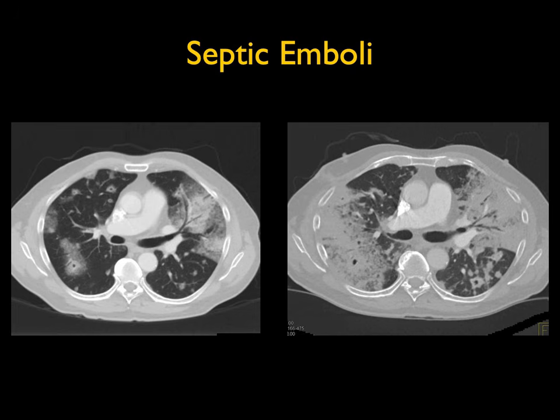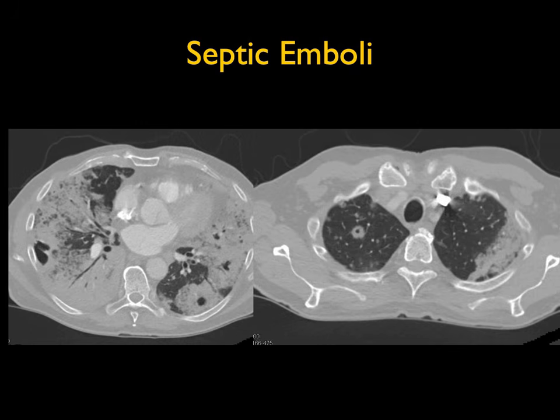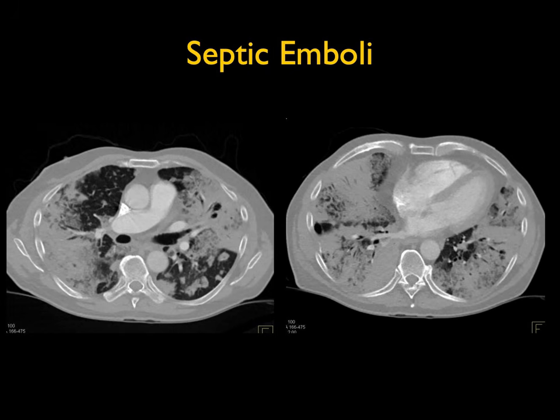In this case, patchy infiltrates, air bronchograms, multiple nodules with cavitation. When I start seeing cavitation and infiltrates, I'm always thinking about septic emboli. Cavitary lesions, yes, you can get with metastatic disease, let's say a uterine leiomyosarcoma as one example perhaps, or other necrotic tumors. But septic emboli, usually peripheral, but they can also be central. But when I see multiple peripheral, often wedge-shaped nodules, I'm thinking about septic emboli.